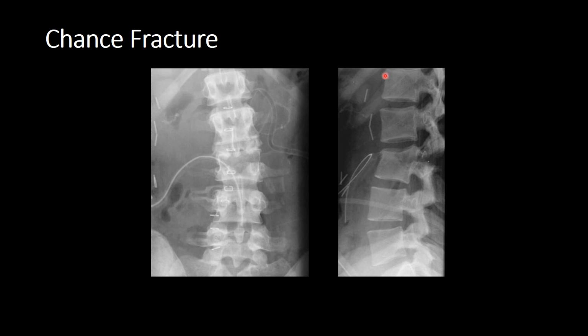Let's have a look at our anterior vertebral line. So there is some loss of the anterior vertebral body height of the superior vertebral cortex, but actually the alignment seems relatively well preserved. Let's have a look at the posterior vertebral line. Remember, you're looking for that nice posterior curvature of the vertebral bodies, and we can see we've got retropulsion through the pedicles, which cause the diastasis of the interpedicular distance.